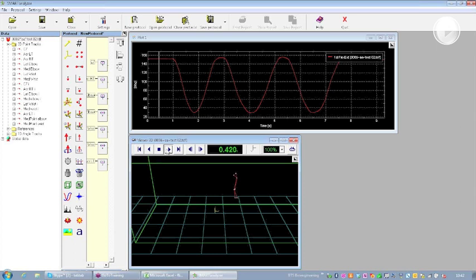if our angle movement is connected to the real acquisition that we did. Okay? Now, we can, for example, decide to define the range of motion of this 1D angle. Of course, what is the range of motion? The range of motion is done making a difference between the maximum extension and the maximum flexion in order to have the maximum movement that this angle can cover.